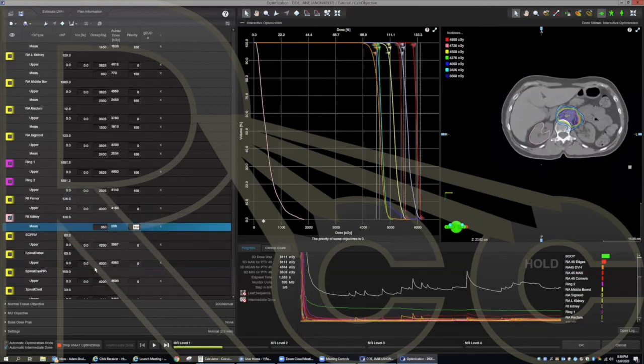Yeah, so maybe clinically I would push a little bit harder, because my shoulder has really not dropped much, but I'm pretty close to how I would do this clinically. Okay, it's leveled off. I'll hit play again.